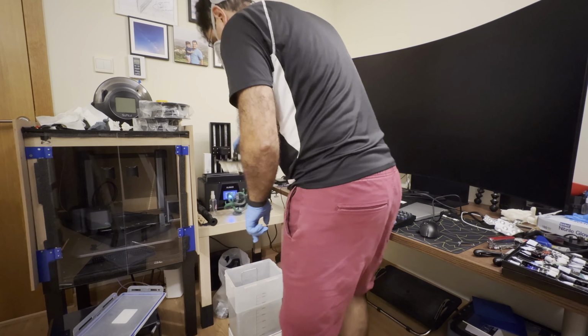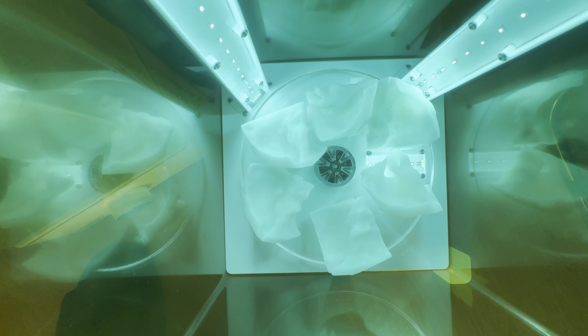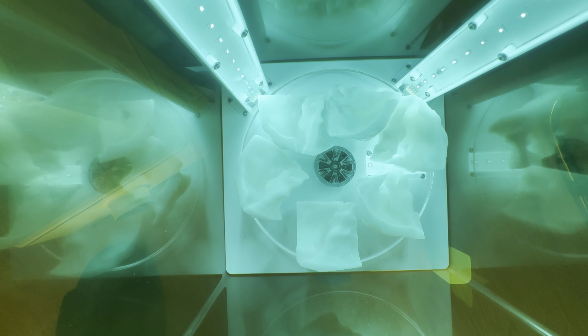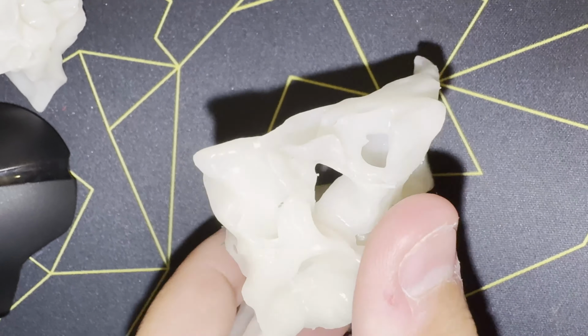The next step now is to take them off the build plate and then remove the support. After they've dried, you have to cure them in UV light. I used about 10 minutes. That's the final result. And I confirmed that using support allows the ossicle to be printed perfectly. And the ones that had not used support, they did print, but they weren't as long and as nicely defined as in this one.